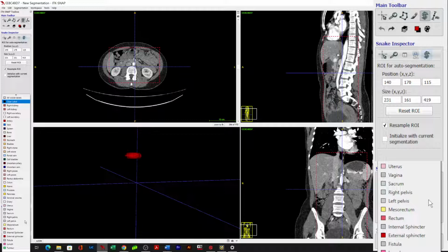So say you've erroneously labeled something, or you want to rapidly change or relabel something, you can stipulate that you'll only draw over an existing label with a new label. Well, let's show an example.